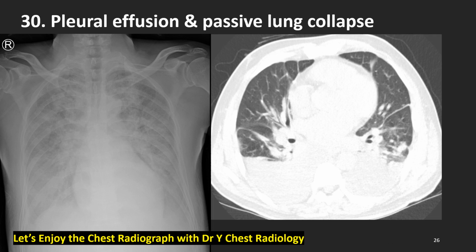Let's confirm with the axial lung window setting CT. His heart size is normal, and his bilateral anterior lung is very okay, with only mild pulmonary edema. Let's go back to this AP view. Bilateral heart border is okay. This means his anterior lung is okay. That also suggests less possibility of lung lesion. Diffuse lung lesion possibility is very low.